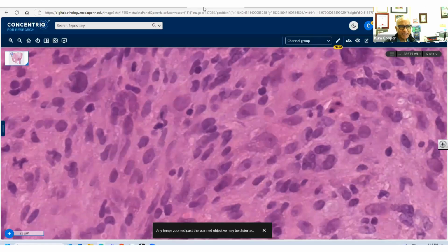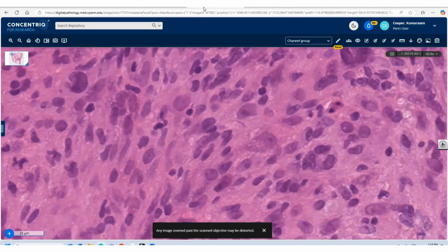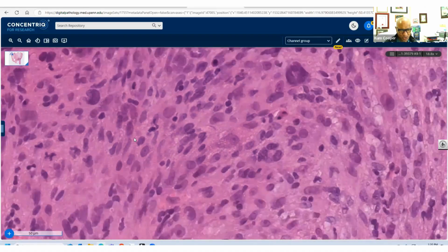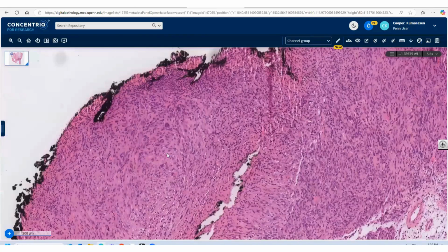Still, desmoplastic melanoma can be negative for melanoma markers, still SOX10 and S100. That's very true. Can it have this degree of nuclear pleomorphism? I don't know. I'm asking. And he's very young, Ahmed. He's very young, 29. Those are more elderly patients.